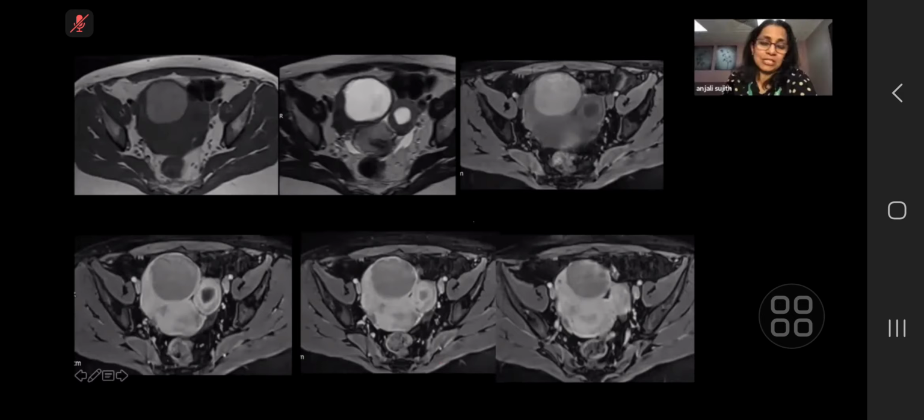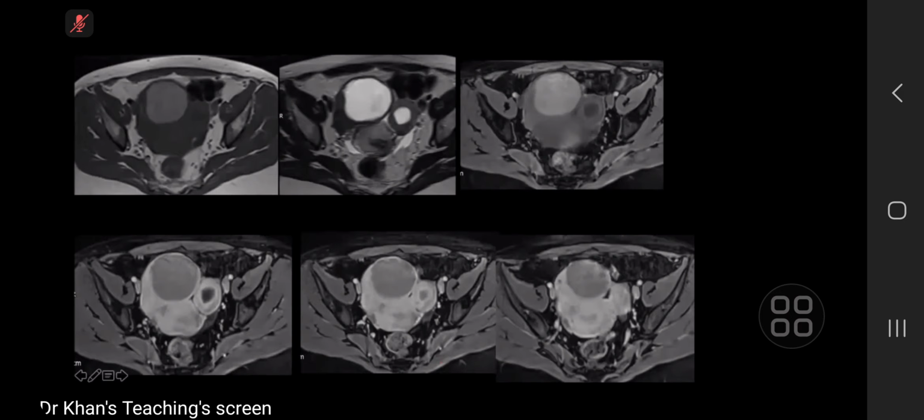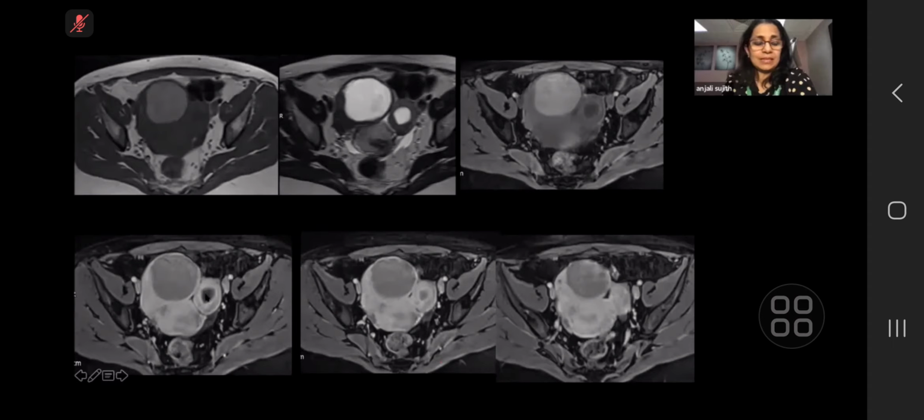Yeah, candidate number 2. Okay, so we have selected MR images of the pelvis. The top left is an axial T1, T2, and then I think we have dynamic sequences post-contrast. Yeah, the dynamic post-contrast sequences are at the bottom, and this is a fat-saturated T1 axial. Okay.